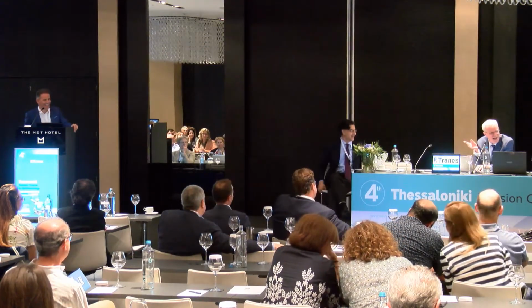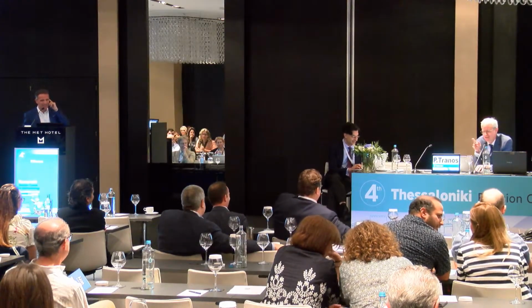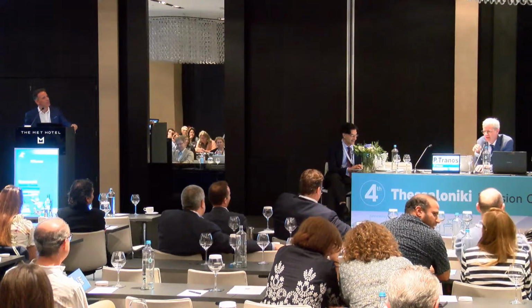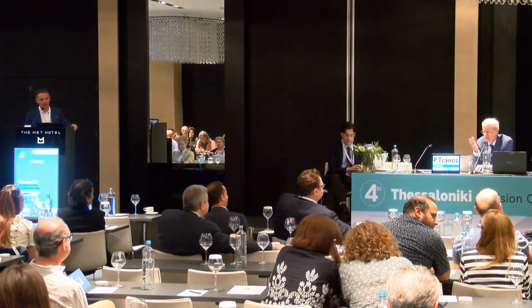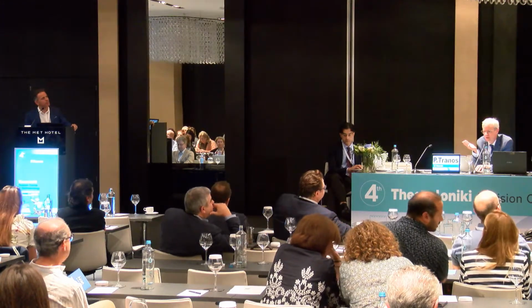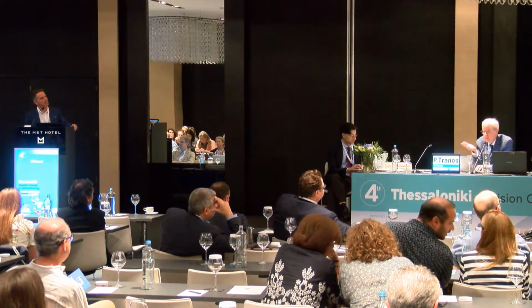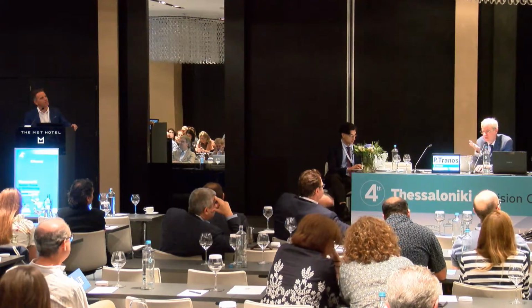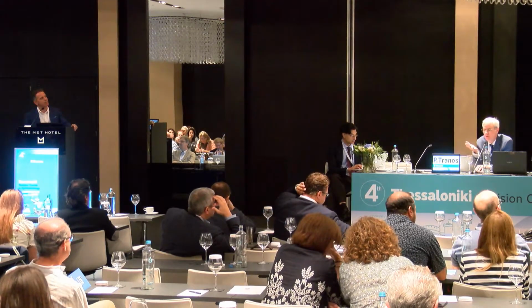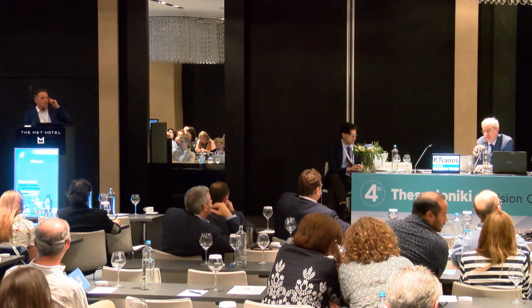There's one difference: angiographically you tend to get a very profuse leak in treponemal disease early, but we see the classic masking and then the hyper, AMPPE. The textbooks are wrong. It's not a benign disease. This gentleman's lost a lot of vision. His central vision is going to be poor. His acuity might be good, but it can be a very aggressive disease.